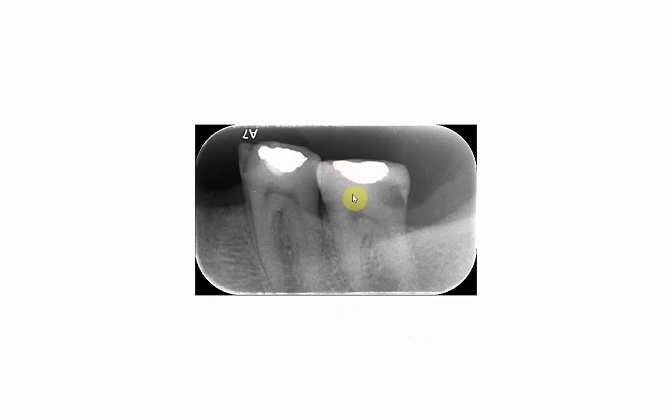Amalgam, of course, takes its shape from the cavity, depending on how the cavity was prepared, whether it is a class 1, class 2, or MOD. But once we look at the radio opacity of the material, it will appear completely radio opaque, and we will see future radiographs where we will compare the radio opacity of amalgam in relation to other filling materials or restorative materials.